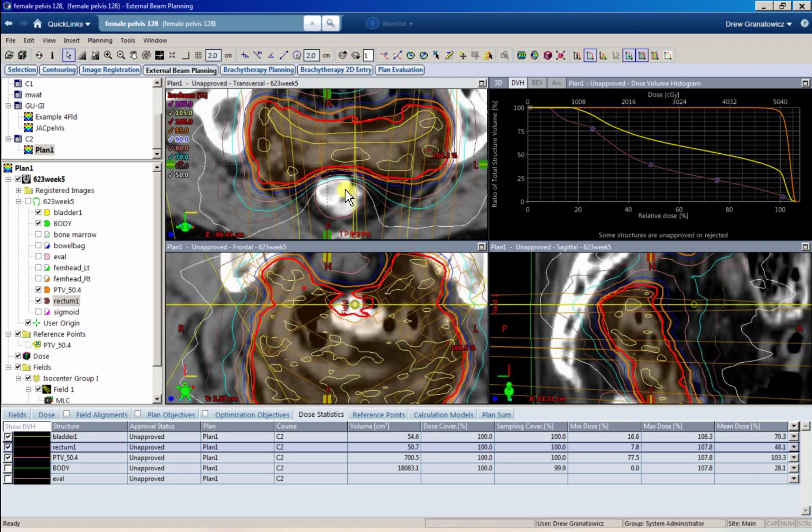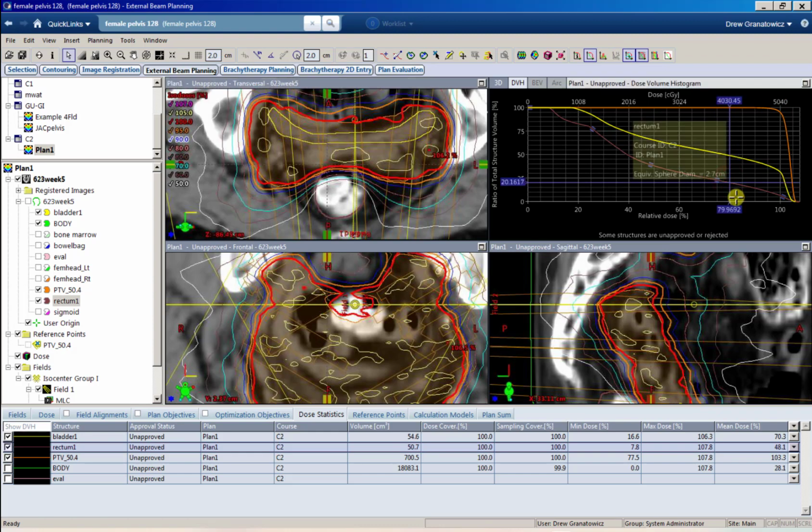And it doesn't have to be looking at 50% dose. Let's say another one is he wants 4,000 to be less than 15%. We're at about 20% right now, so we would need to move that 5%. But again, 4,000 is about your 80% line.